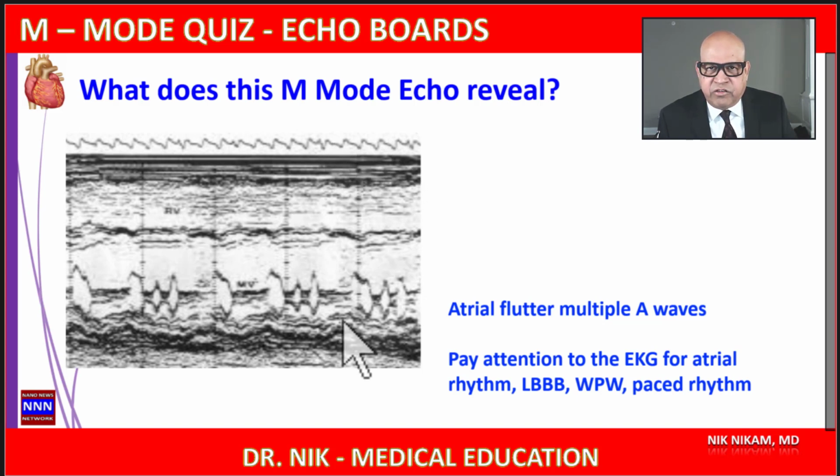Similarly, in case of an atrial flutter with 2-to-1 conduction, where it may mimic sinus tachycardia, AV-NRT, or junctional tachycardia, an M-mode echocardiogram might help you to identify flutter waves, which may help to make a differential diagnosis. So it's important when we are looking at a tracing, pay attention to every point on the tracing, and then you will be able to make a much more meaningful diagnosis.